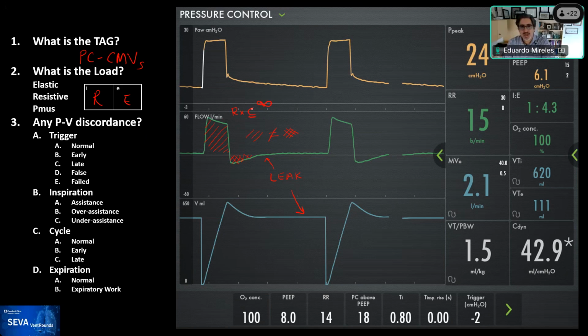Exactly. So the time constant becomes eternal, because the compliance of the lung is infinite, the lung is open to the universe, right? So infinite time constant. Essentially the flow will reach what we call flow limitation, a constant flow. Yeah, it would go down to a plateau, to an asymptote. So the point here is there's a very large leak during inspiration and during expiration, and you see this because the lungs are open to the universe.